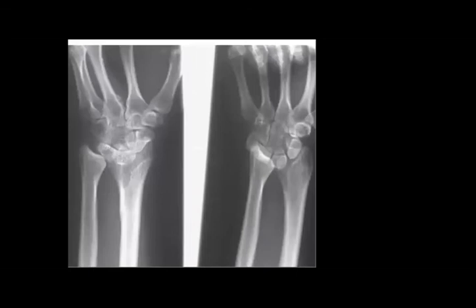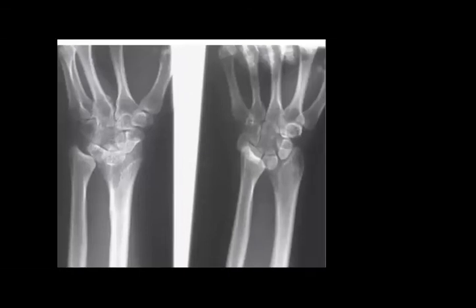So you can find it bilateral. There is underdevelopment of the ulnar margin, as you see. So it can be primary or secondary. Yeah, so secondary, as you mentioned: trauma, infection, multiple osteochondroma. Perfect. Bone dysplasia, Turner syndrome. Women are more affected than men. Yes. Let's skip this one and go more quickly.